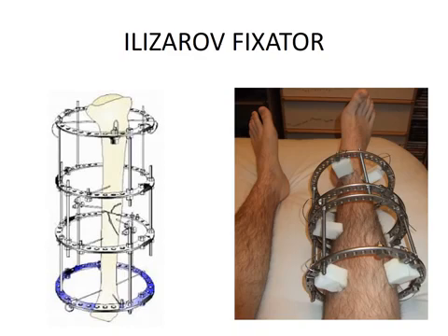The indications of Ilizarov are to lengthen the bone or the limb, used in infected non-unions or gap non-unions, because it works on the principle of distraction osteogenesis, lengthening at the rate of 1 millimeter per day, and the limit up to which you can lengthen is separate for each bone. Ilizarov fixator, a very important fixator. It's a variety of external fixator because the fixator is outside the skin.